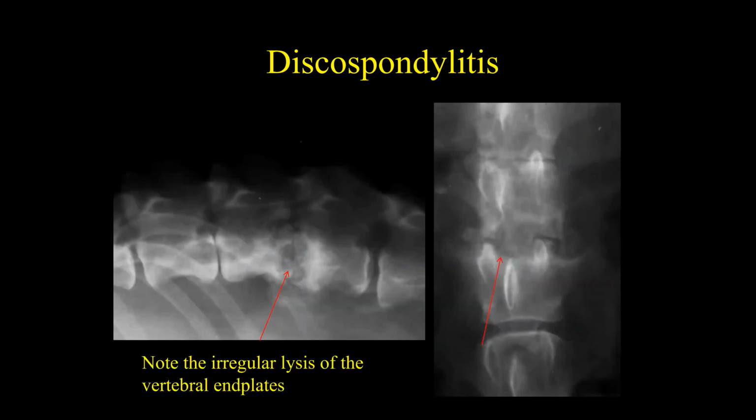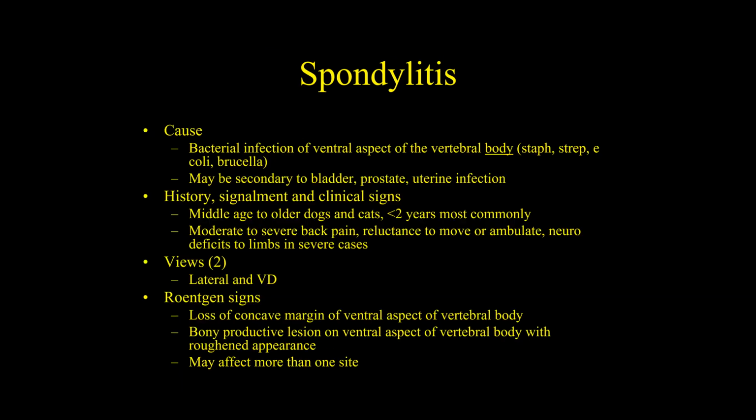So everybody understand the difference between discospondylitis and spondylosis deformans. One is a bad thing, but it's very treatable, and causes severe pain. Spondylosis deformans, on the other hand, looks really bad, but it doesn't cause any clinical signs.